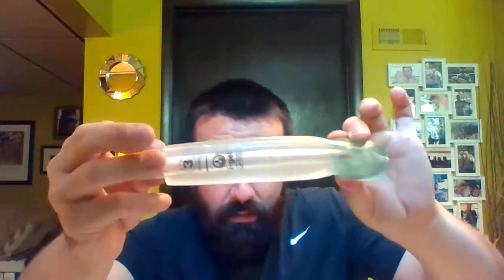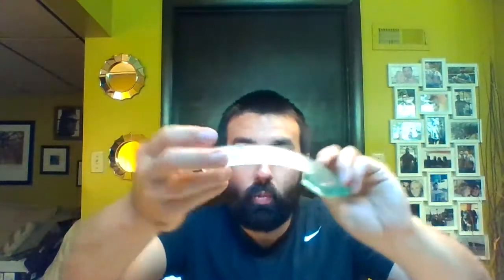The I-gels are a little bit different. Same general premise. It's a much softer kind of material. You don't need a syringe with these. Same deal, 3s, 4s, and 5s, and it's actual weight-based, okay? Same deal, just no big balloon on the end, and it's supposed to make a good seal. These things, same deal, do not protect the airway. It's essentially something that allows you to ventilate your patient when you can't do so with manual ventilation.